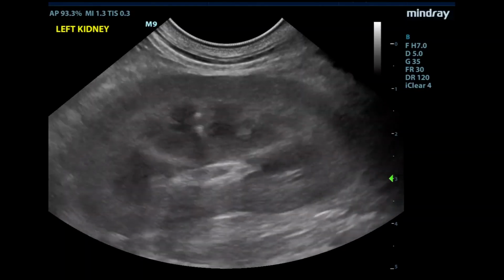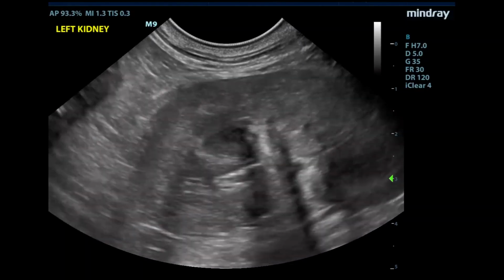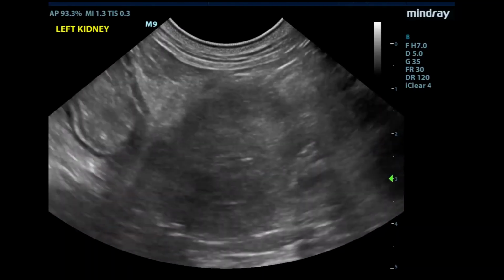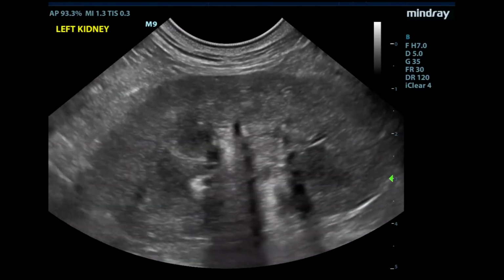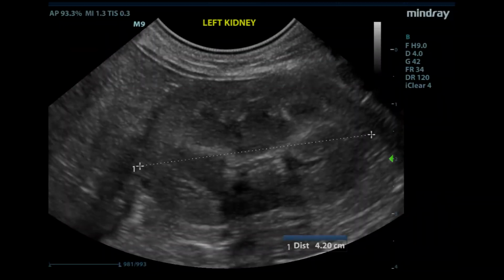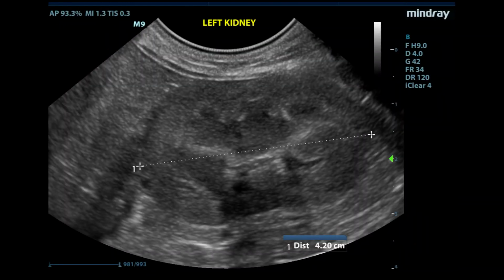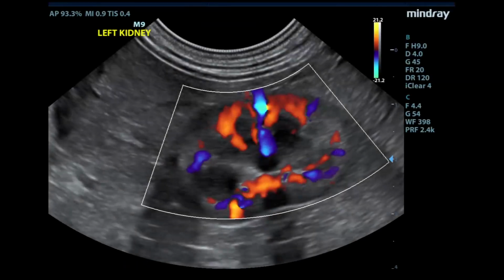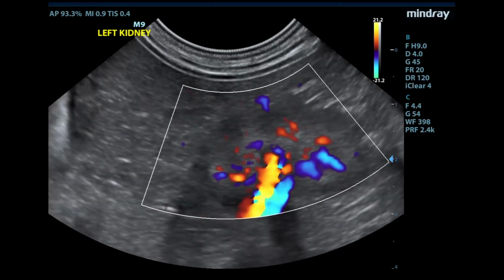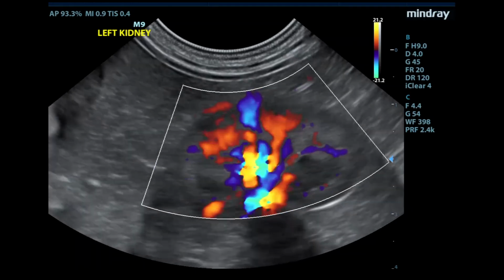Normal dehydrated animals may have a relatively hyperechoic renal medulla due to decreased urine flow. Normal dehydrated animals will have an elevated urine-specific gravity, but normal BUN and creatinine. Because of the extensive vasculature, the renal medulla should not be biopsied.